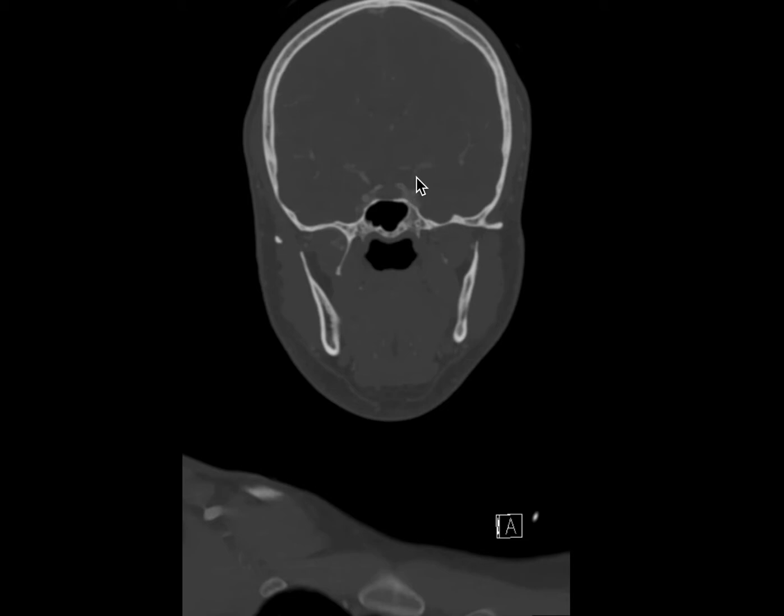Now, we don't see the anterior choroidal artery well in this patient, but we do know this is another important branch that just precedes the bifurcation point right here into the anterior and middle cerebral arteries.